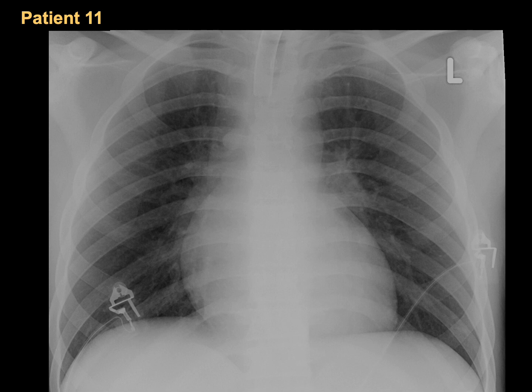And this is our last patient, a 50-year-old male who fell off a ladder, only 6 meters. The patient is intubated for some reason. A, intubated. B, it's okay. Okay. I think I'm not happy with the diaphragm on the right side, not very well elevated relative to the left side. It should be more elevated than that. Okay, and you might find that there is like a double shadow here. I'm not very happy, but actually the lung is reaching.